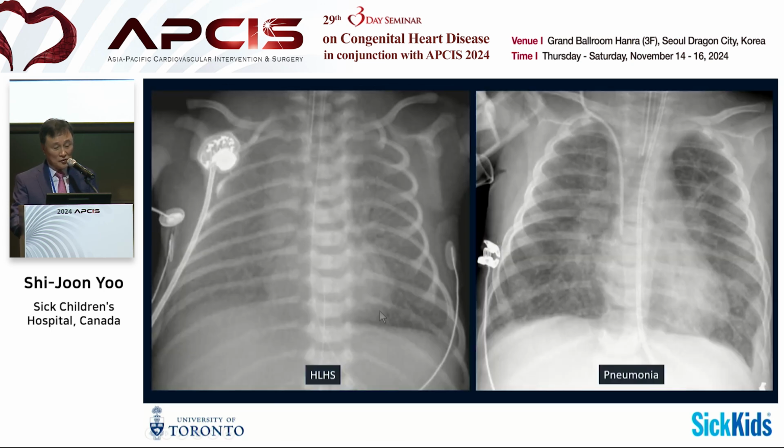Okay. So on your left side is hypoplastic left heart syndrome with restrictive ASD, with almost identical findings. On your right side is pneumonia. What is the difference? The left side findings are very, very evenly distributed, homogeneous, while on the right side, with pneumonia, you have significant regional differences. So there is a simple difference.